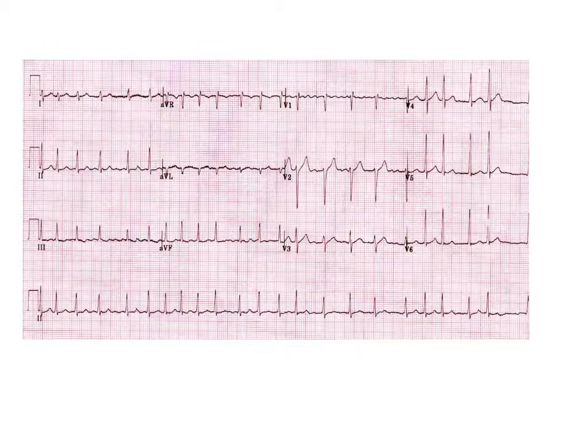Rate's hard to determine because, again, it's atrial fib. This is where I let the machine tell me what the rate is. But from one lead to another, from one beat to another, it might be 150, another beat it might be 75. So, all right, good.